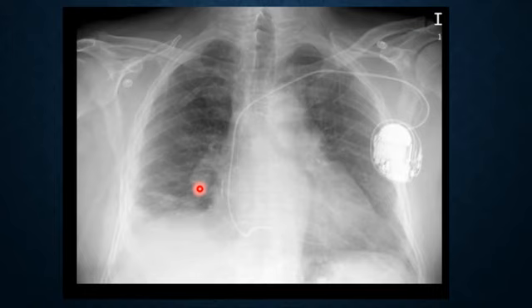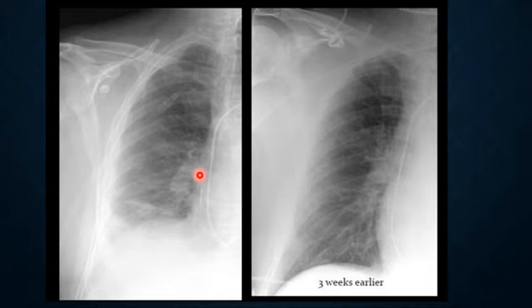pulmonary artery, engorged, enlarged. Some people say it should be up to about 16 millimeters as a normal value, but I don't think that's very accurate. And if you see it abruptly ending, it's again a sign confirming the presence of pulmonary embolism.